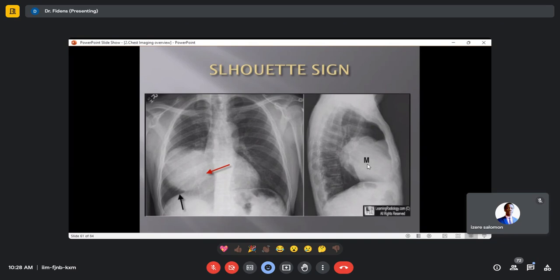So air bronchogram is a pattern seen on chest X-ray where the air-filled bronchi are seen in a background of opacity. Thus, I promote you to the 50th year of medicine because you're answering very well.